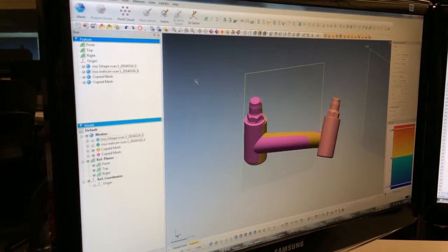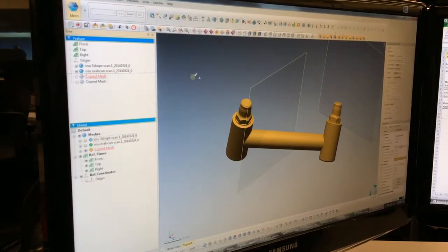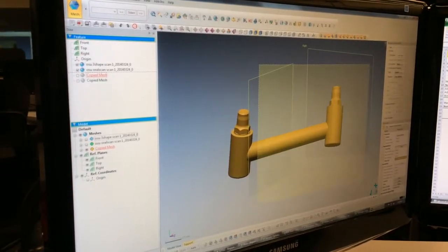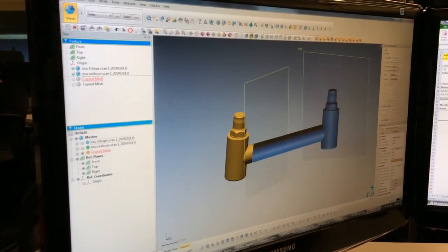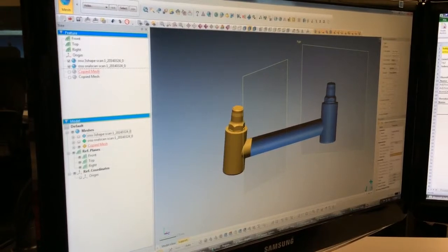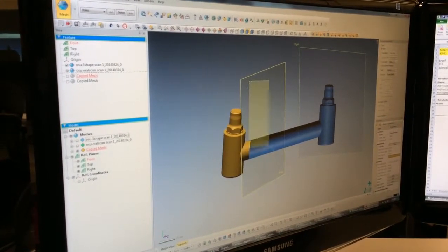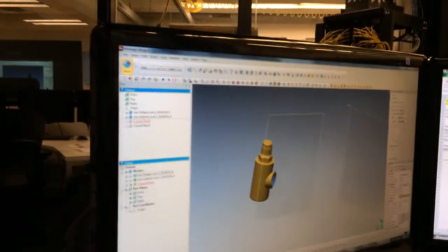And so now I could go in. If you double click on it, it allows you to edit it. I can say, okay, suppose I don't want all of this. Hit delete. Whoops, there were some other files below it. What it defaults to is surface visible only, is what they call that. So I can go like this, hit delete. Awesome, okay, so now that's there.